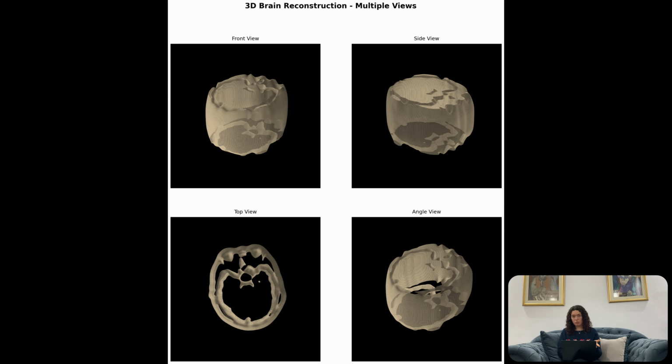So the tumor volume is generated from the Grad-CAM mask rather than raw pixel intensity. The 2D attention mask is converted into a smooth 3D probability blob using Gaussian smoothing. This produces a solid rounded tumor volume rather than a blocky or hollow shape.